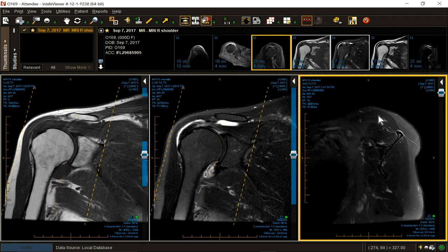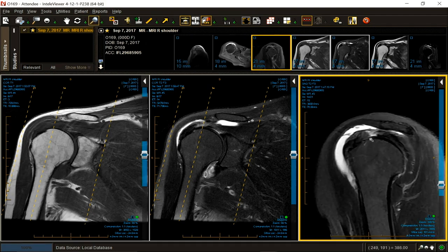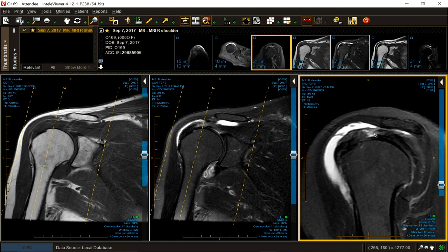So this is kind of a strange, more medially positioned tear. It's a deep tear, and it's one that you sit there and struggle over whether it perforates the outer fibers or not. In the end, it doesn't matter. In the end, what matters is it almost perforates.